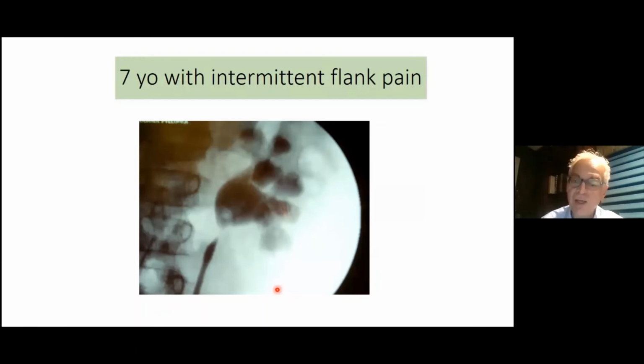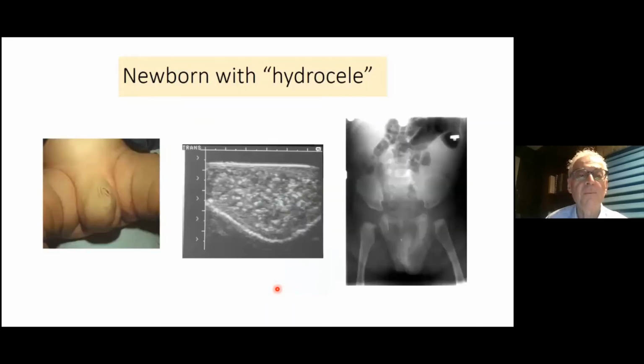We still like to do them. I don't know if it's more for resident practice, but we get a nice retrograde pyelogram. You see that filling defect, and you know a different cause of UPJ obstruction, and you want to make certain that you excise it. Well, how about this one?